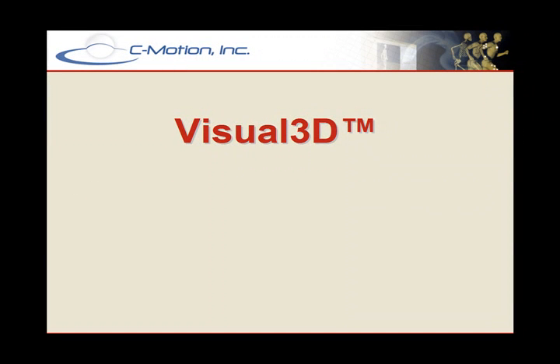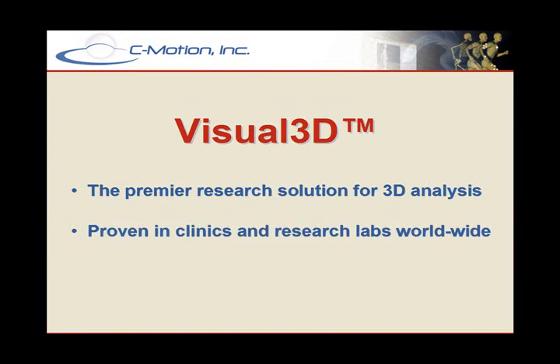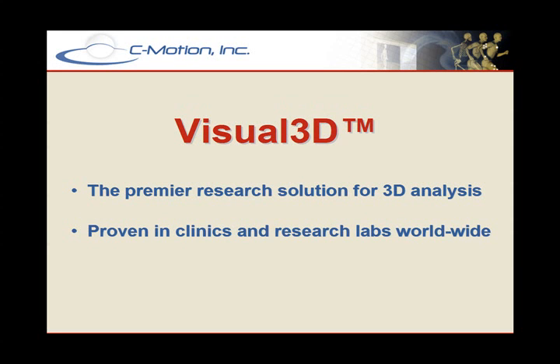Visual 3D is the world's leading software solution for 3D motion analysis, and it has been proven in scientific and clinical research labs worldwide. Visual 3D is the tool you need to fully manage, analyze, and report on your 3D movement data. In fact, Visual 3D gives you total control of your data.